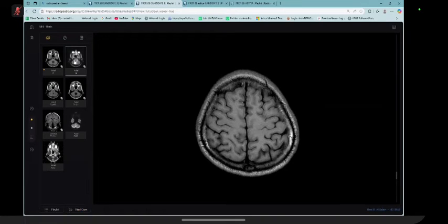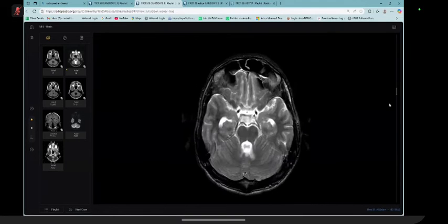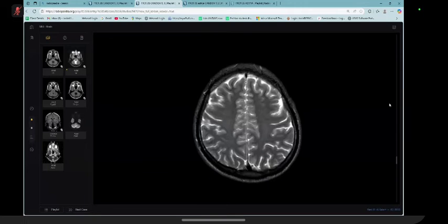Another case for you, and this is a good case. Let's see how you are managing it. It is an incidental finding in MRI of an adult, and he has cervical symptoms.